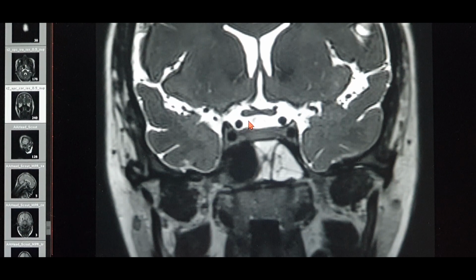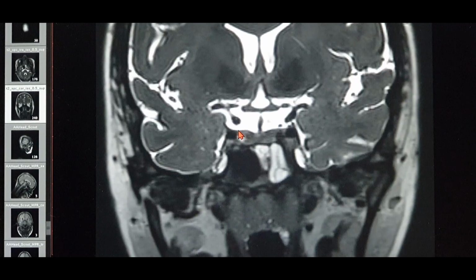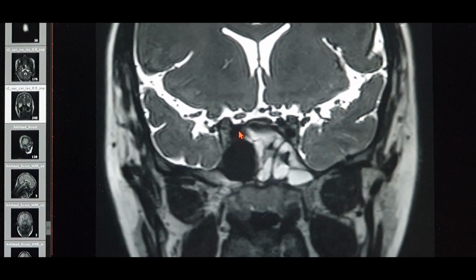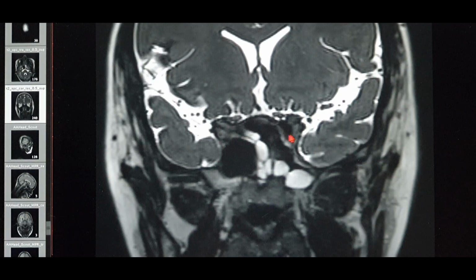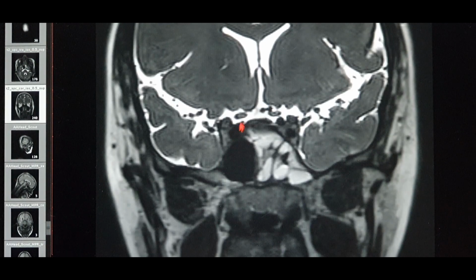Now I have posted a lot of skull base surgery videos for the anatomy, where I've taught you that the internal carotid artery is always inferolateral to the optic chiasm. So always remember that. In the cavernous region, this is the sphenoid sinus, remember that. Laterally you can see the temporal lobe over here, and that's the sphenoid sinus. You can see the carotid artery on the superolateral aspect.